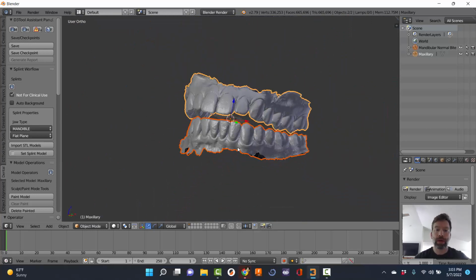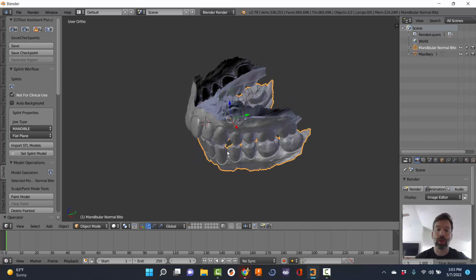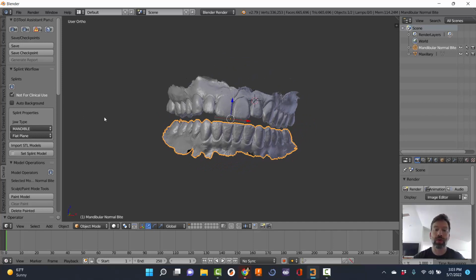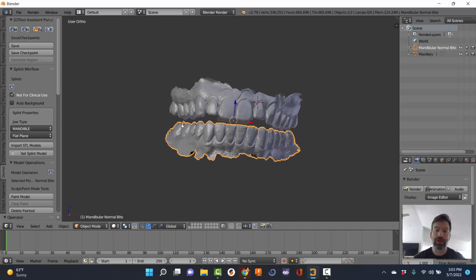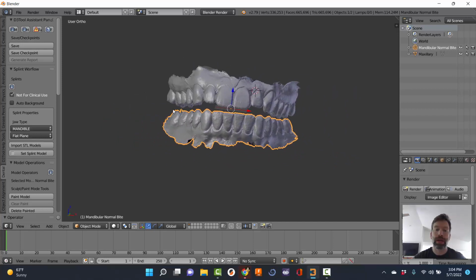Okay? You can wheel them around. Now I'm going to refresh your memory. If you press the left button, all you're doing is changing what you are centered on, your point of interest on these models. If I right click, it allows me to do some other things as far as moving things around. But if I press and hold the wheel button, it allows me to wheel things around. And if I want to translate, move things left or right, I hold the shift button and click the wheel button. That's the little scroll wheel.